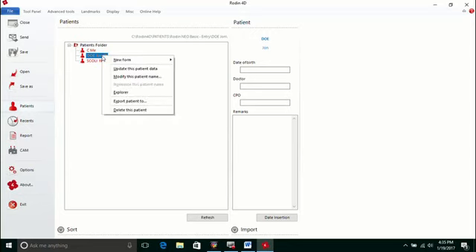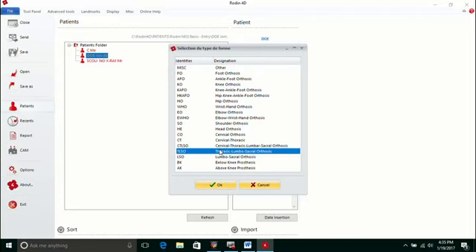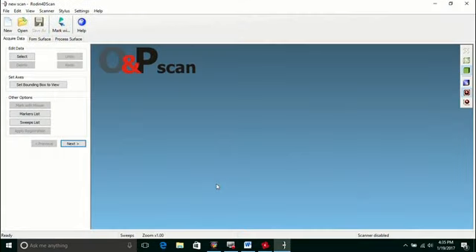So if I right click on this, option, New Form. If I have a scanner hooked up, I click on New Scan. Identify what model type you're going to scan. Click OK. And this automatically brings up the scanning software. Now if I had a scanner attached, in the lower right it would say Scanner Initializing, and you'd start your scanning process.